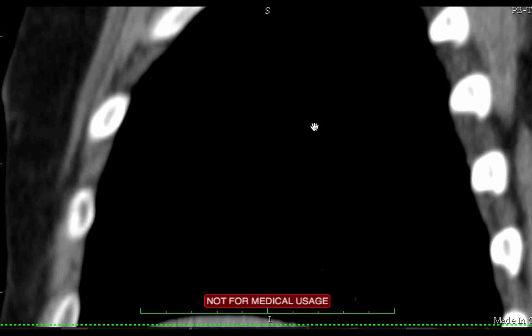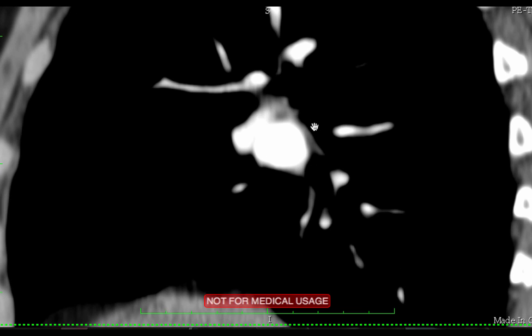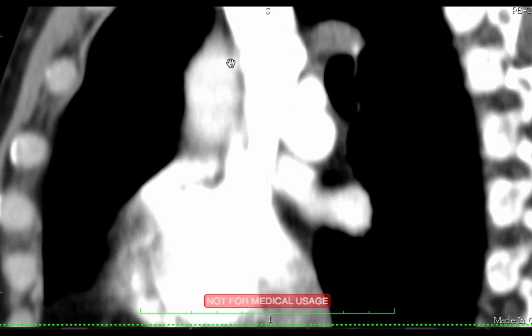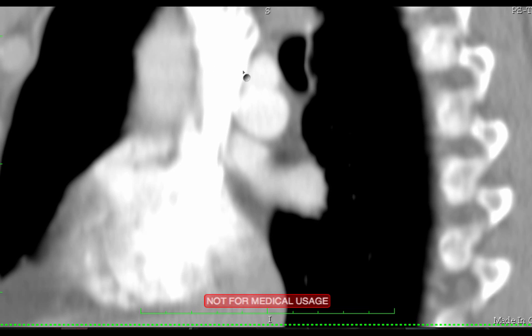But here we're starting in the right side of the lung, and therefore this is a big pulmonary artery, I believe. Let's see if I can window that into the realm of visibility. Okay, so this is the SVC, densely opacified by the blood that was contrast opacified in the left arm, as we saw before, going into the right atrium and right ventricle to get reoxygenated.